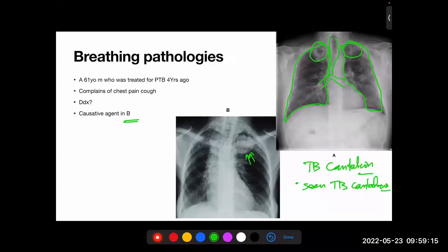I think I'd have a problem identifying that on a chest X-ray, because for this one you've said the pointer is the aspergilloma within the cavitation occasioned by the mycobacterium. But in the absence of mycobacterium, how else would you tell that this is most probably an aspergilloma and not any of the other causative pathologies?